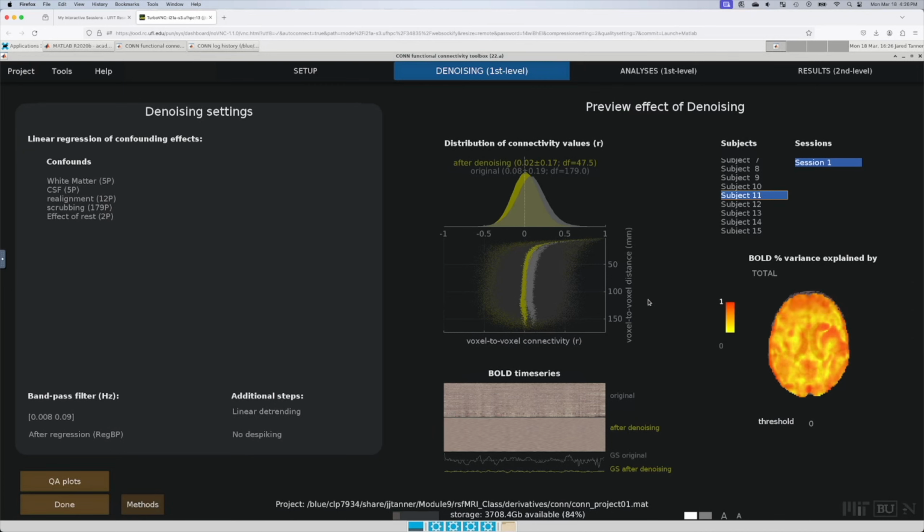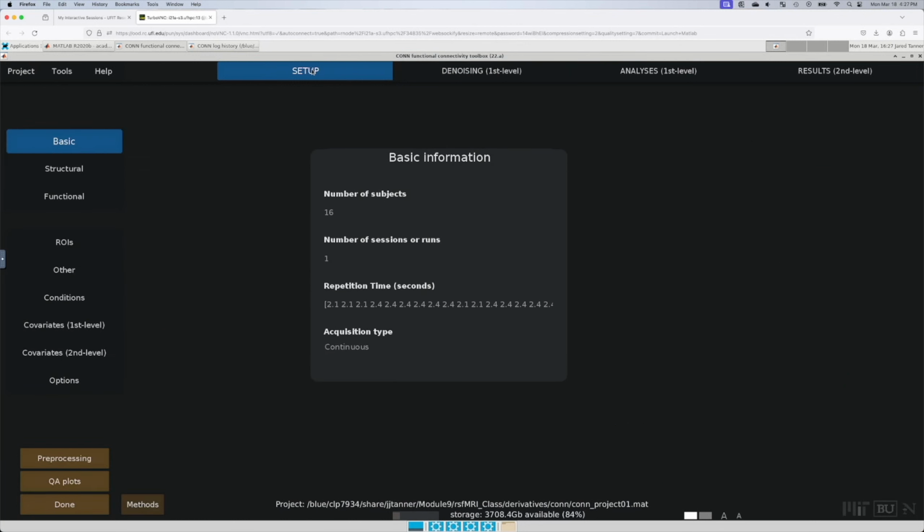Now again, you don't have to remove those 4 participants, and that would save you some time on this assignment, but just for completeness, I showed you removing them because we just didn't have enough data left of the scan. In particular, one of them, we really had no data left.